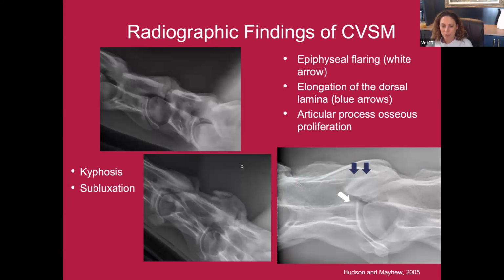What I have found most commonly is that the contrast is getting back there, but it's hard to see because we have thick soft tissues back there. So really collimating in that caudal cervical spine, and sometimes modifying your kVp. You want your kVp for these to be on the lower range, and that can really help amplify the contrast media. So those are my pointers on that.